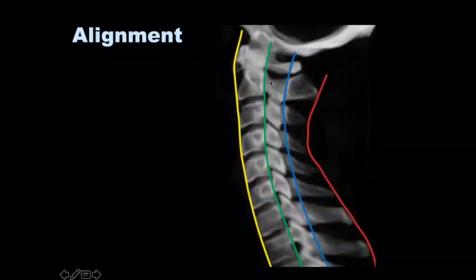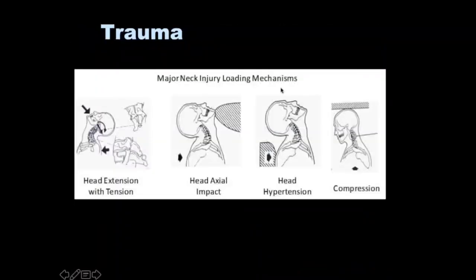All these should be in alignment. The only thing about the spinous process line is that C2 to T1 are all in alignment, and C1 is just off it. That's just a normal appearance of the cervical spine, but you need to make sure that the anterior, posterior, and spinolaminar lines are all in alignment.